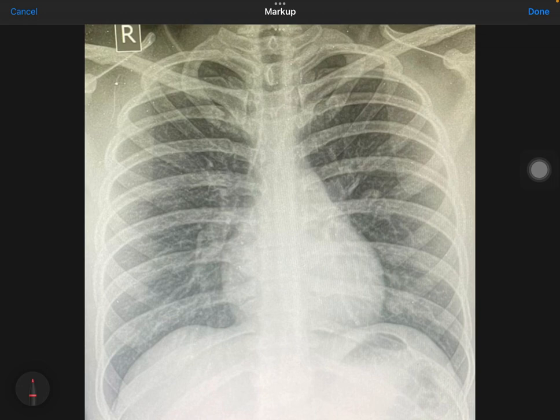First, what we see when we get an X-ray: first we see the identification details of the person, the name, the age, the sex, and the date on which the X-ray was captured. These are important because identification is the foremost thing. We have to see whether we are checking the X-ray of the patient concerned only. The next thing is date. With the date, we can compare the X-rays. Like if I have an X-ray now for the same patient, and an X-ray after 3 months, I can compare both and come to a conclusion.